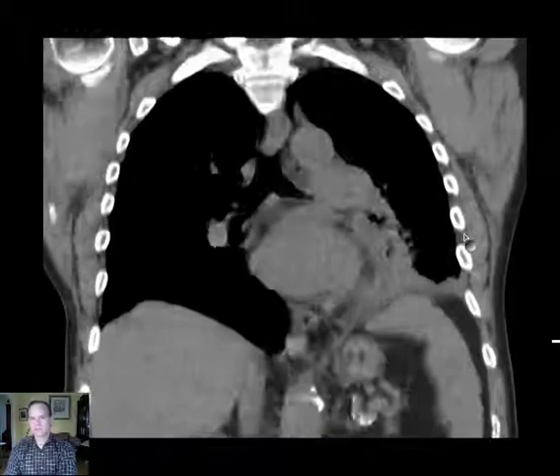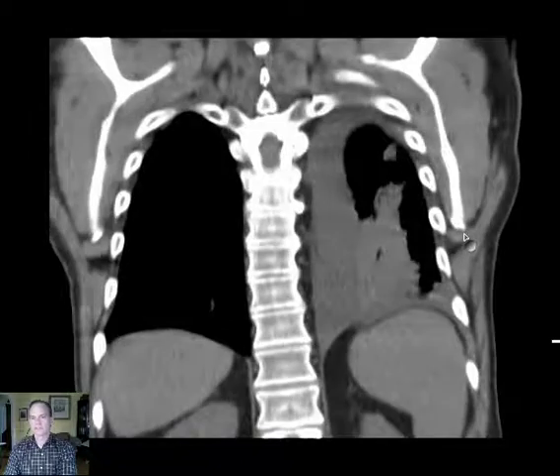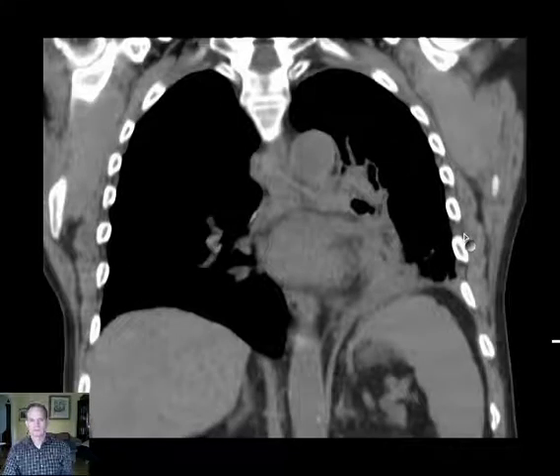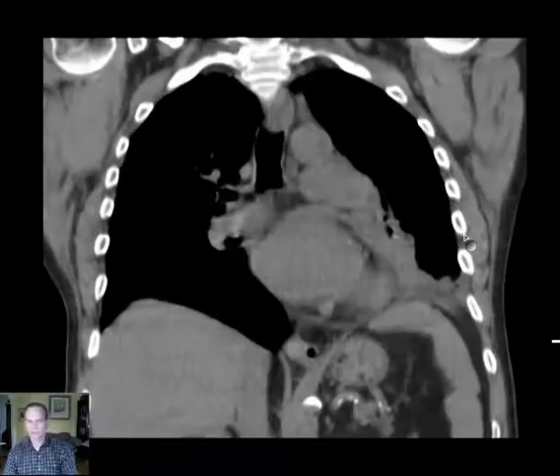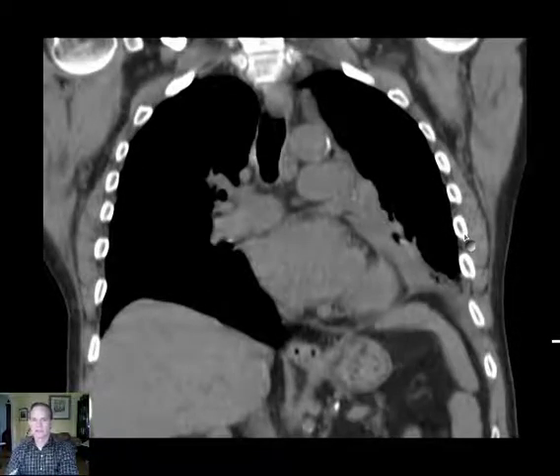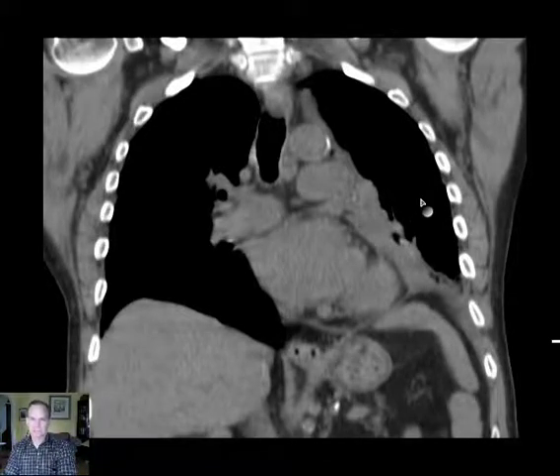It really helps put things together in your mind by looking at the chest coronal images as well as the axial. Same information pretty much, but our minds aren't as good as the processor in the CT scanner at putting together coronal images based on what we see purely on the axial plane.